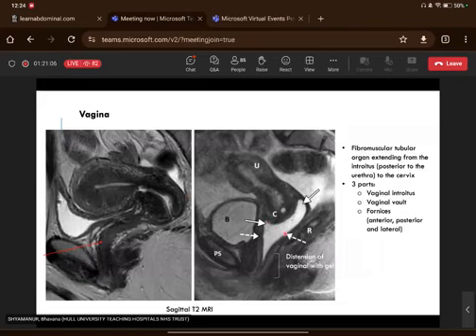But in this patient here who's got gel instilled into the vaginal canal, this opens it up a little bit, and then you can see the fornices a lot better. So here's the anterior fornix, the space between the vaginal walls as they come around and the cervix, and that's the posterior fornix.